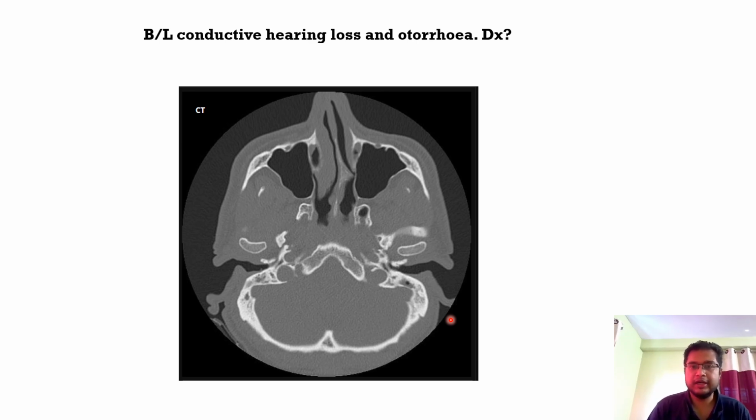with this particular condition. So often it is given in the reports, it is overdiagnosed, the tegmen tympani erosion, and the patient is said to have cholesteatoma along with the CSOM. But there is usually thinning of the tegmen tympani in chronic otitis media because of the inflammation. There is some rarefaction and thinning of the tegmen tympani, but it should not be overdiagnosed as having eroded.